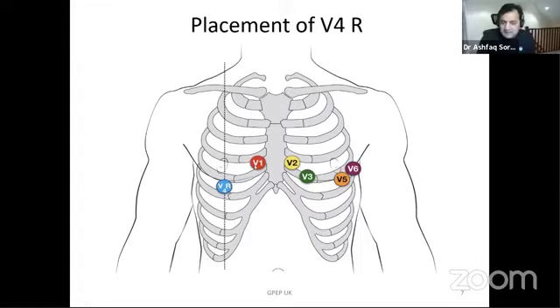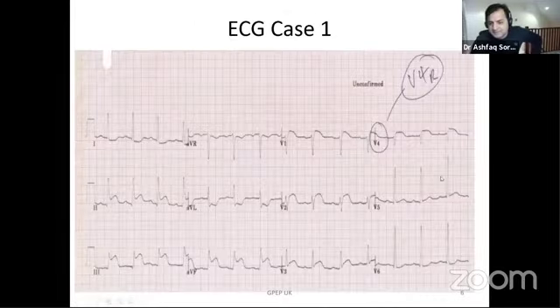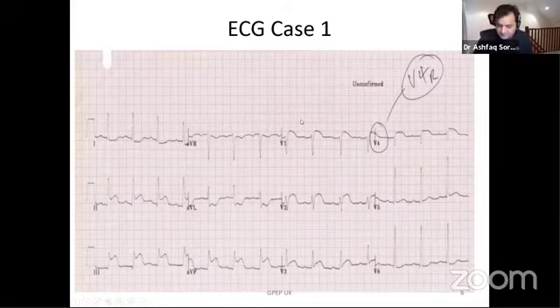जैसे ही आपने suspect किया कि यार कहीं इसको right ventricular infarct तो नहीं है, क्योंकि lead 3 में ST segment elevation ज़्यादा है compared to lead 2. You put this lead, pick up from here and apply here. Now, this is exactly looking at the right ventricle. जैसे डॉक्टर साकिब ने आपको सुबह बताया ना कि it's like a video camera which is looking at the right ventricle. And then you will see this ECG which confirms that patient has got the right ventricular infarct.